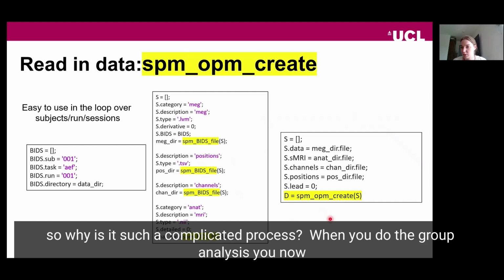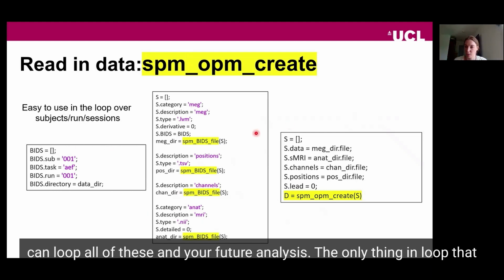So why is it such a complicated process? Because when you do the group analysis, you can now loop over all of this in your future analysis.